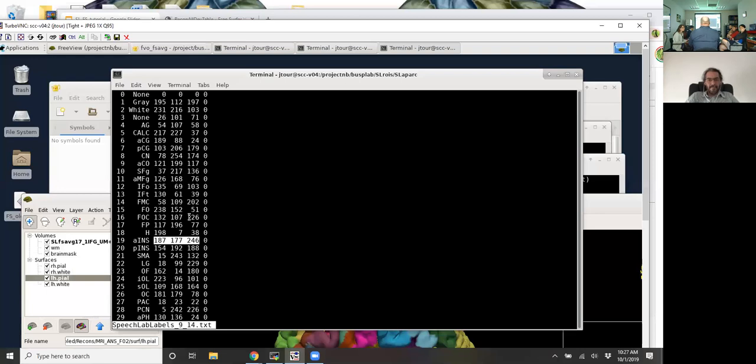Ultimately, they all have different syntax. Alfonso uses a syntax where he doesn't even bother with that list. He uses the index, but he doesn't bother with this list of numbers because he knows he just uses the order of the list.